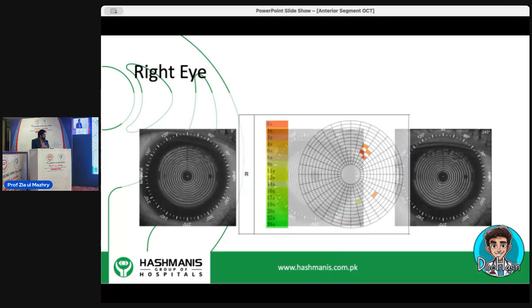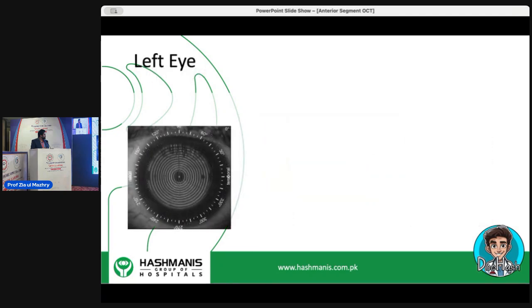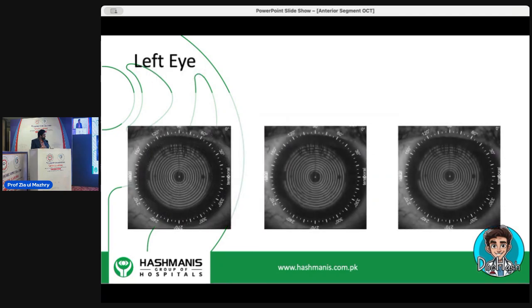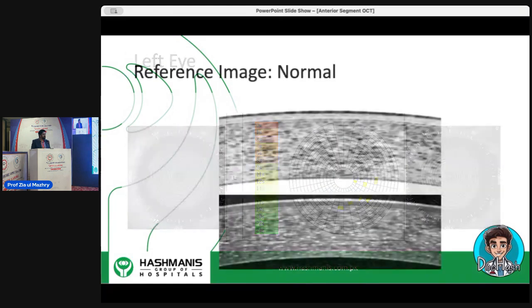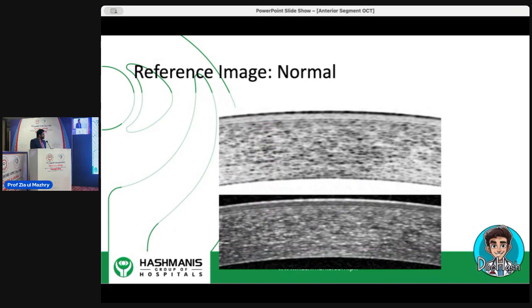And then when we look at this, this is also at the same location. Then when we go to the next eye, the other eye, again very similar, and the breakups are happening at the same place. Then we were going to the OCT. So आप देखें इसमें white on black and black on white दोनों है.